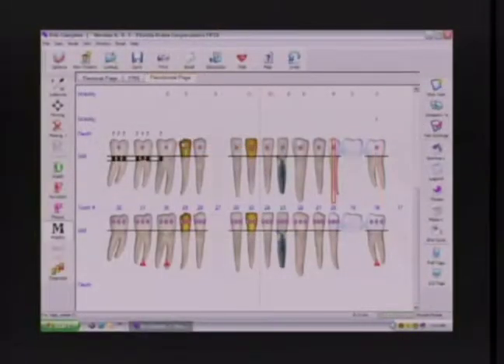That's different than a multi-aspect pass. The path is not definable within the software. So part of that strategy is to refer to the computer and see where that bright orange cursor is. Because mobility is not buccal and lingual, it went straight from 1 to 16 and dropped straight down to 17 and coming back. Whereas where there are multiple aspects, it changed the pattern.